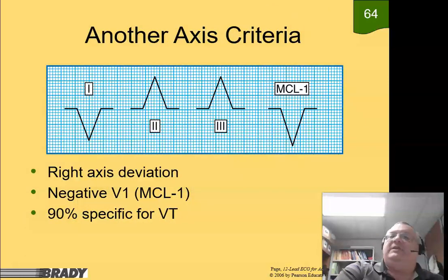However, every now and then you get one that doesn't fit exactly that criteria, but I will tell you that it's 90% specific, and that's when you got down, up, up, down. All right? So, let's take another look at a slide here.